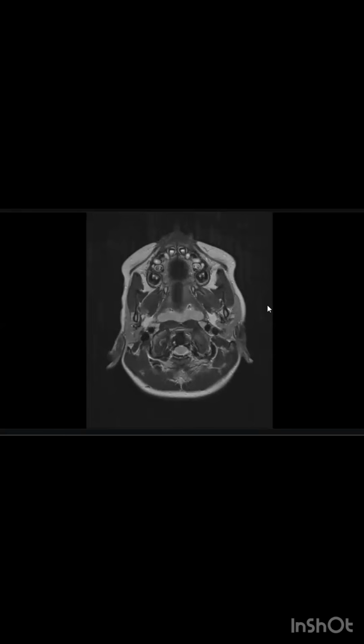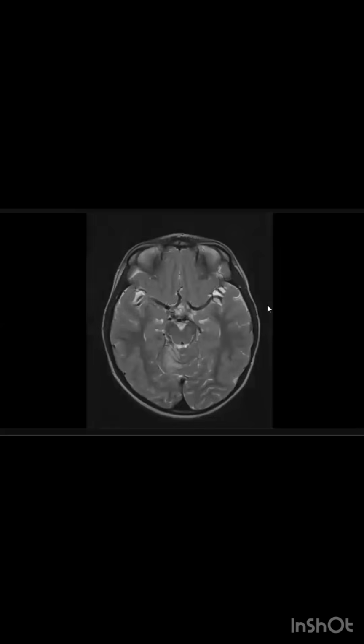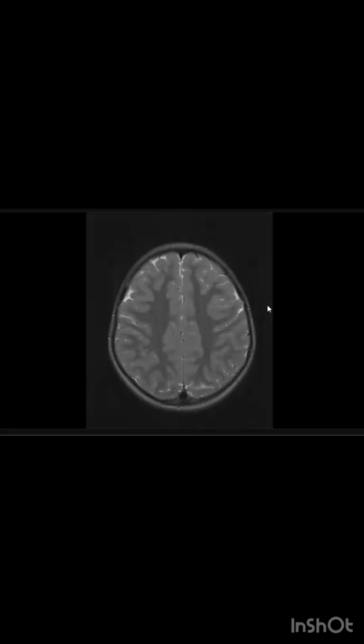You can stop. Again, it's not scrolling. Yes, start the scroll. This is MRI T2 for the same baby. I will have a look and then comment.